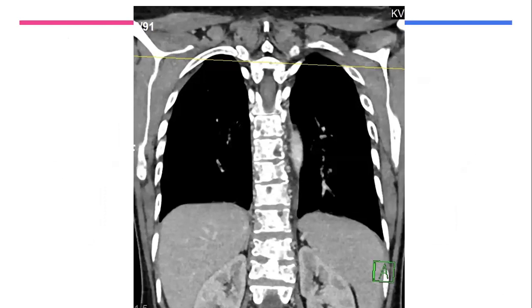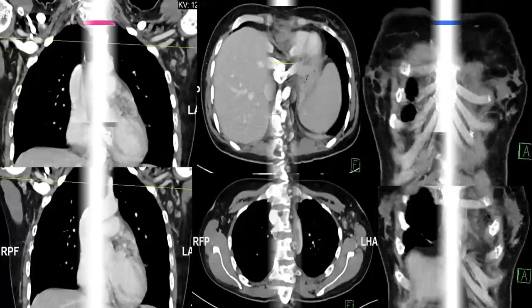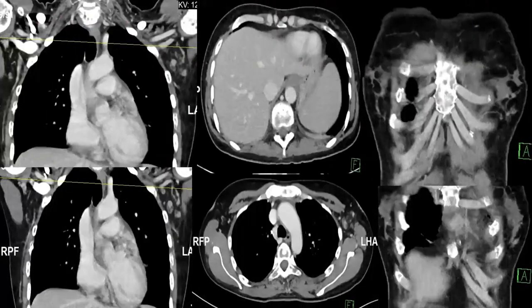The lungs and mediastinum were free, and this is the bone. Okay, how can we make use of this CT chest? The lungs and mediastinum are okay. Do you want to see anything else? You can check for the breast in the CTs. Excellent, well done. We can look for the breast. Could you see any abnormality here?